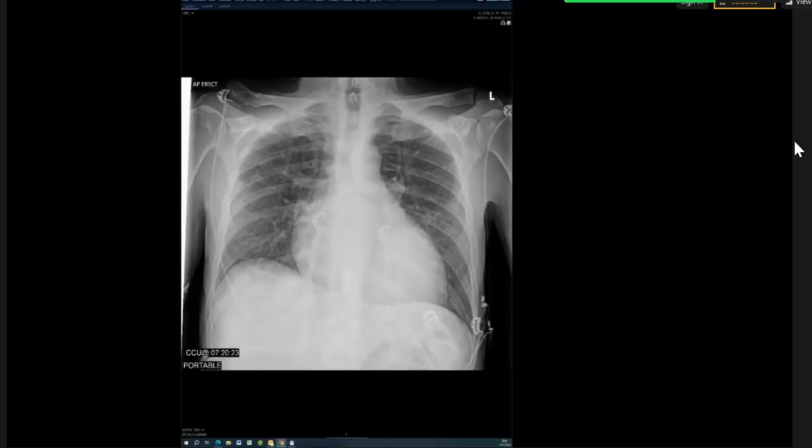That's okay. Okay, thank you. So, Samavia, that is, I think, all. What is this? The nitrofurantoin-induced ILD. Okay, that is just a comment.